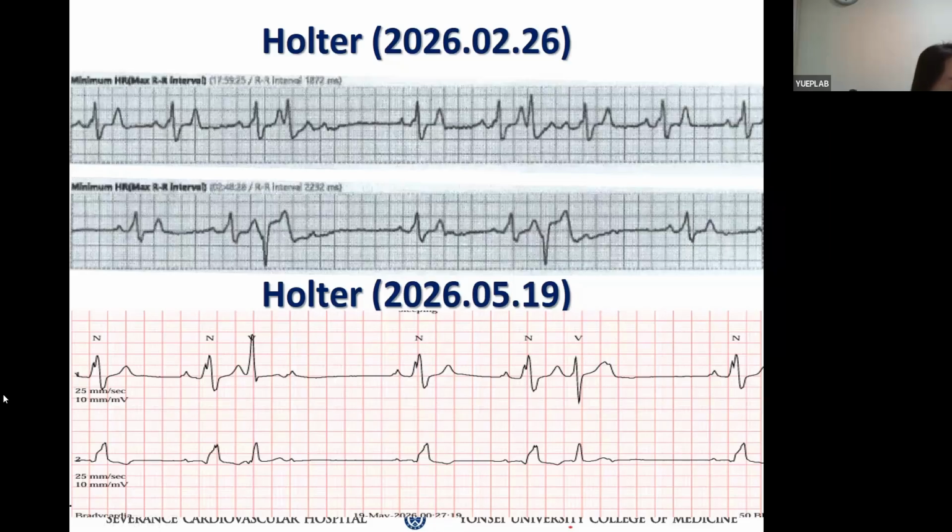Okay, so why is the QRS axis changing? Probably the ectopic beats are coming from different foci. Are you sure about that? Be careful when you say that. Measure the R to R. Okay? Different. The first coupling from sinus to the R is shorter. The second one is longer. Does that make a difference? In which of the strips?